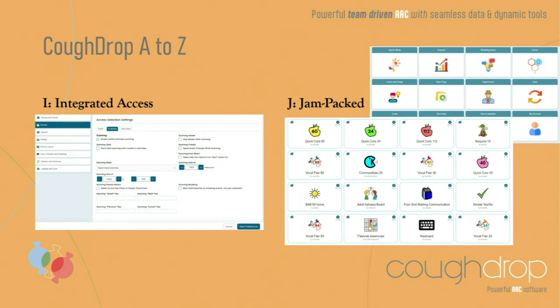So we've talked a lot about what CoughDrop can do in terms of functionality and tools, but also think about it for your vocabulary. Recently I was talking to a school out in Missouri, and they were looking at this because there are so many different vocabulary options built into the software that you can trial different vocabs. So keep this in your mind as we continue to talk and come back around to reports.